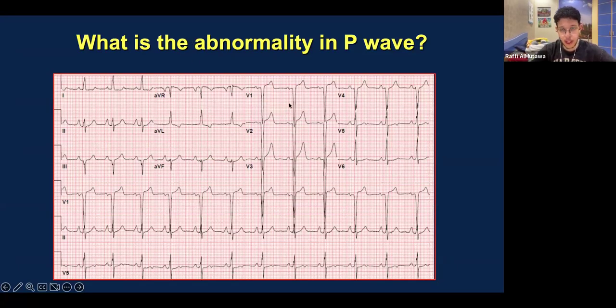Right ventricular hypertrophy, like we said, and you have to look at V1, and you have to see, for example, is the R wave greater than the S wave, or is the R wave greater than 7 millimeters? Here, the R wave is not that great, actually. The R wave is down. The Q is buried over here. So it's a negative R wave. So it doesn't really go with right ventricular hypertrophy, but actually, you should think more of left ventricular hypertrophy, but it's not that case if we do the math.